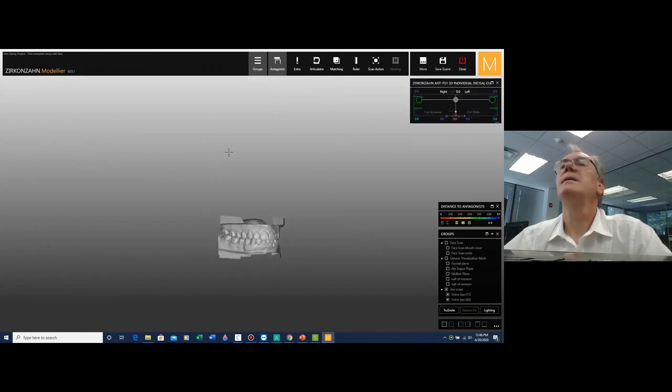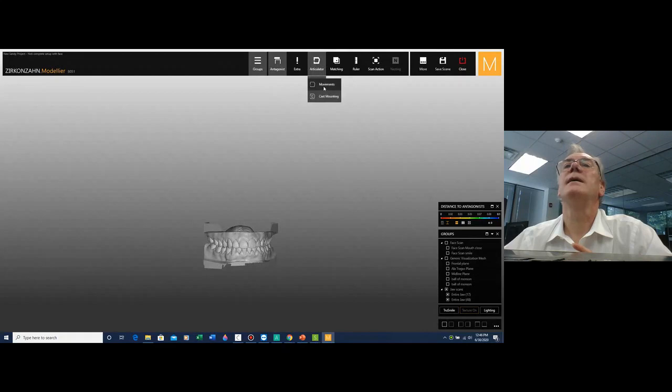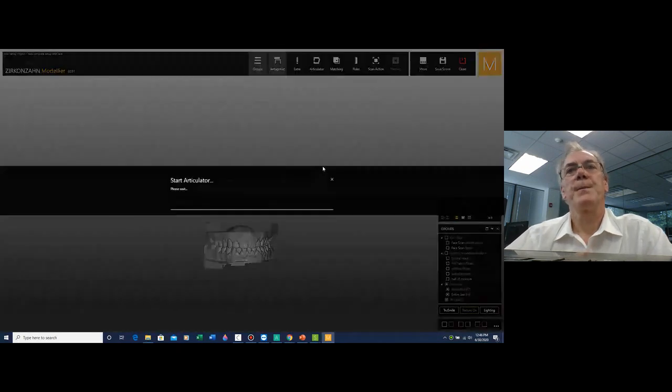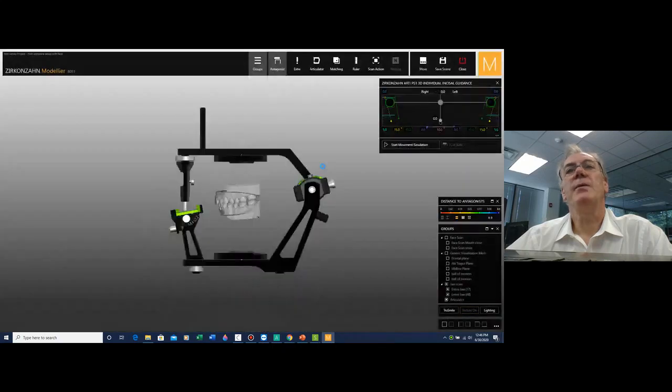We open up the movements. It's not activating this morning. Let me see what's wrong with it. Activate movements. Why isn't it activating? Okay, let me bring it in from the beginning. I'm stalling. Let's go. And here we go.